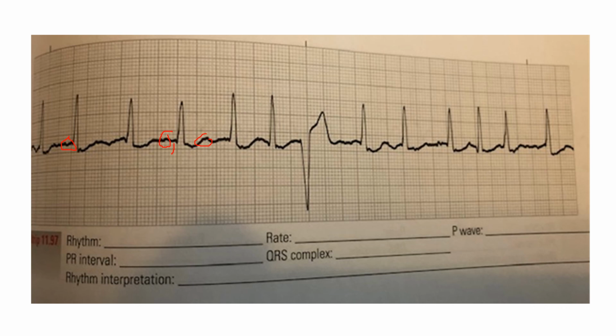They are not sinus beats. This is somewhere in the atrium, but it is not coming from the SA node. This is atrial fib. The atriums are quivering and they have chaotic firing of electricity that is bombarding that AV node, and it's conducting irregularly down to the bundles of His. Now your QRSs are normal, which means that it came from the atrium, so it's atrial fibrillation.